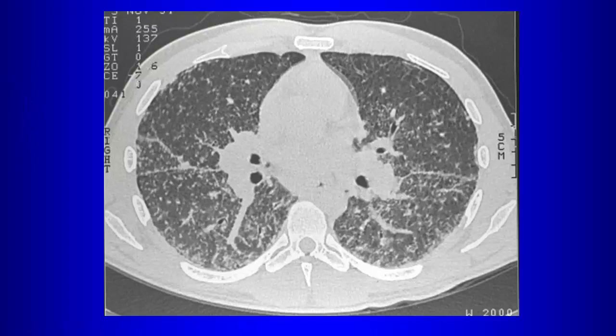Another patient with a micronodular pattern, you ask yourself the question, what question do we ask? Are they touching the pleural surfaces? The answer is yes, so we must decide between random and perilymphatic, and then you ask yourself, are they along the fissures? And the answer here is yes, so we are left with perilymphatic, right. And the two big things in that are sarcoid and lymphangitic carcinomatosis.